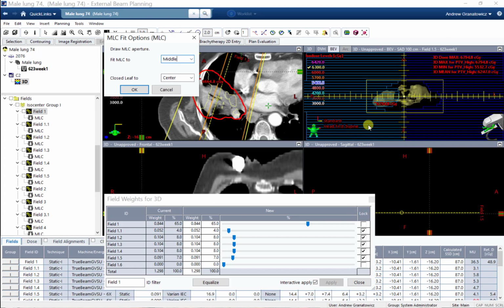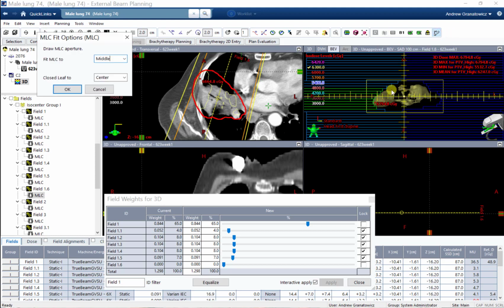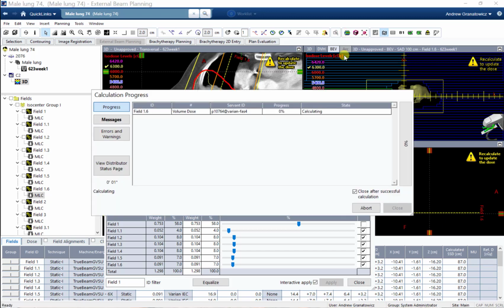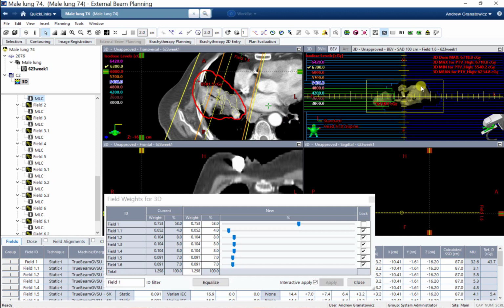Do another field-in-field. All right, so since our 105 volume is getting larger on this medial side now than the lateral, I am going to look at our 107. Yes, so let's turn off 105. Let's focus on our 107, right?